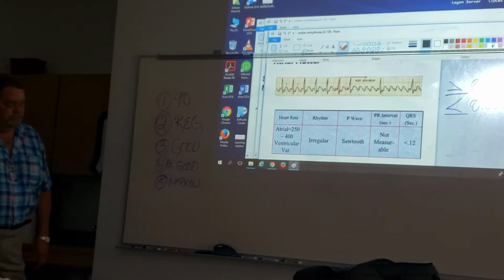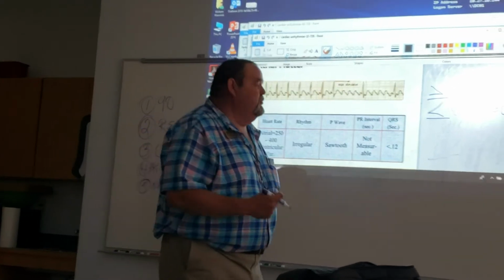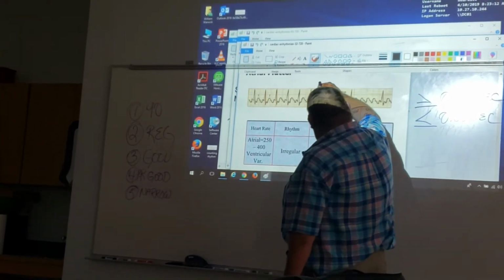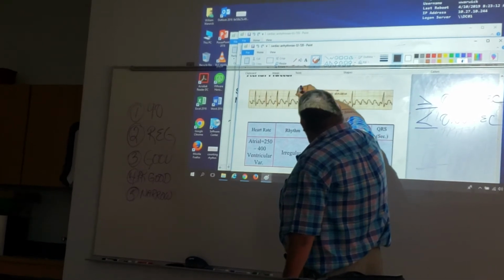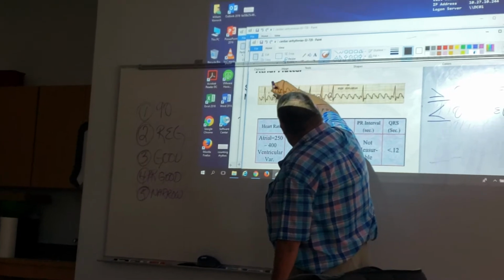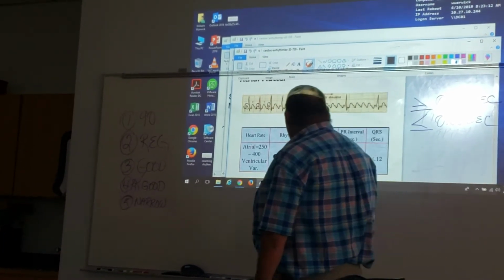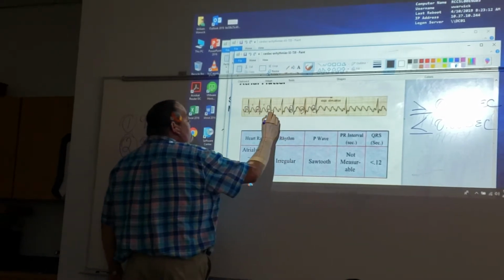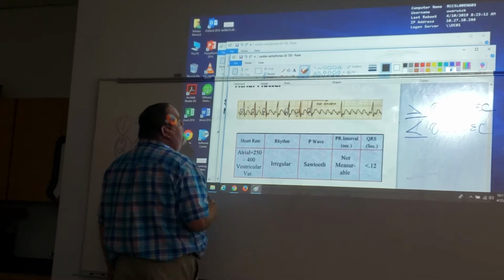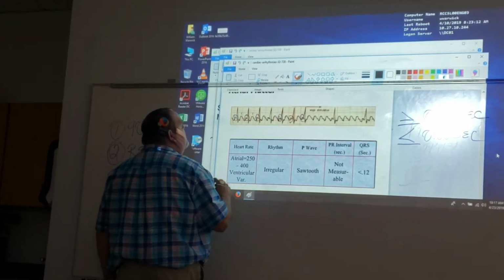Now, this is the thing I want you to remember. This rhythm right here, you notice that this P wave right here is buried right up against them. Right. Okay? Now, notice right there, if you would take and tie this P wave up to here, on every one of them, they match.